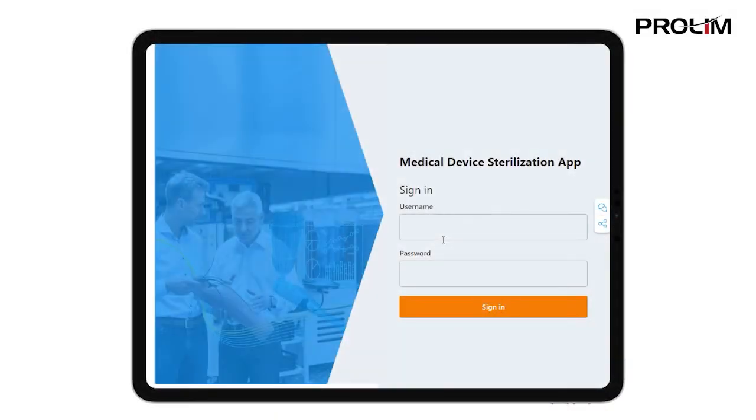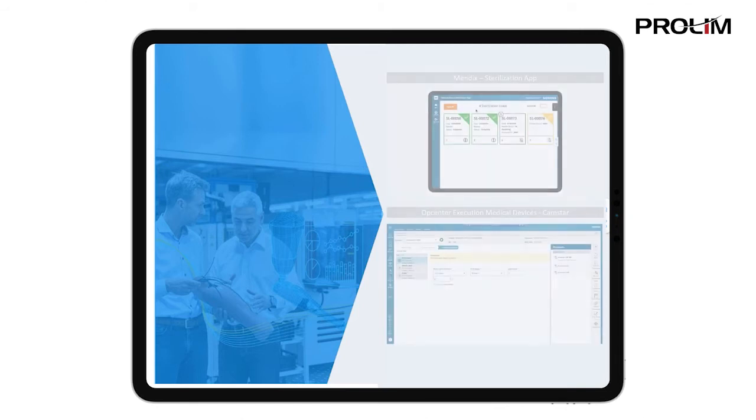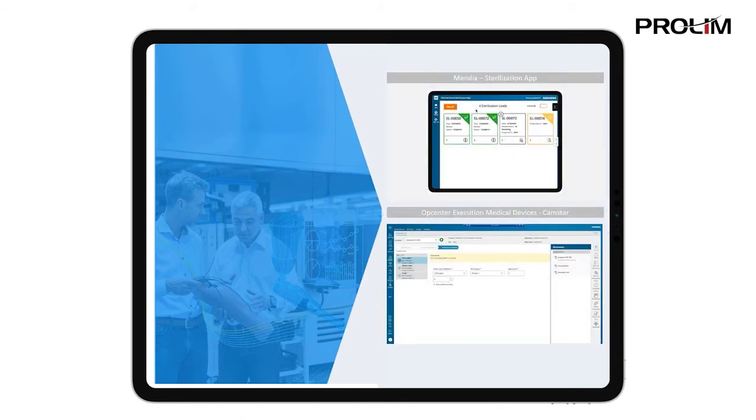This is a Mendix application developed in low code that extends our MES solution called Opcenter Execution Medical Device and Diagnostics. This app provides additional capabilities to manage the sterilization process in Opcenter through an easy-to-use application that can be personalized without any heavy lifting.